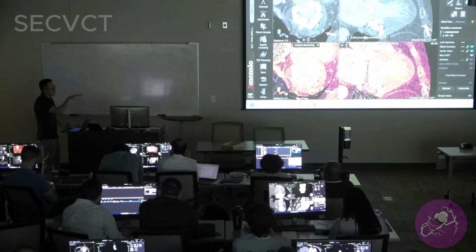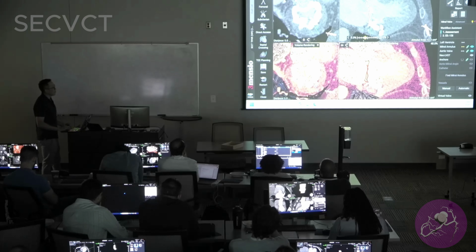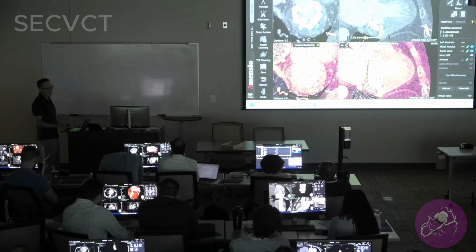Well, hopefully we'll measure here in a second. It will hold in the middle of where it's the tightest, right? If you can imagine that there's no MAC on this edge, and you try to put an off-label TAVR valve in there, there's nothing that's going to hold the valve in place on the side that doesn't have MAC. And so those valves will embolize. So you do, in a way, want to have as much MAC there as possible if you're going to undertake one of these procedures.